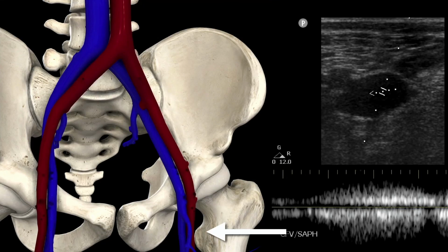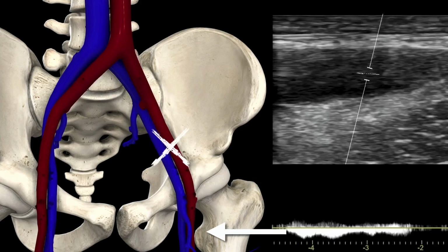Compare that with someone where you put in an obstruction. If you have an obstruction to that flow, like where this X is, you're probably going to have at least a blunting of that venous flow, if not a complete lack of respiratory phasic changes. This is really helpful as you're scanning your patients: put your probe in the proximal vein, put your pulse wave Doppler in there, have them take a deep breath, and see what happens.